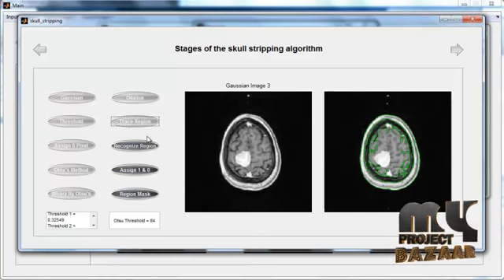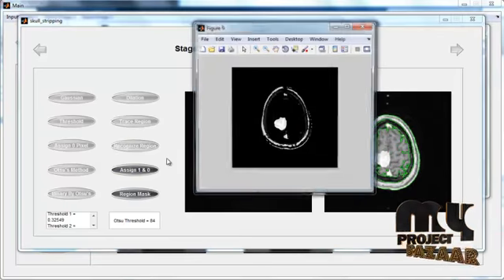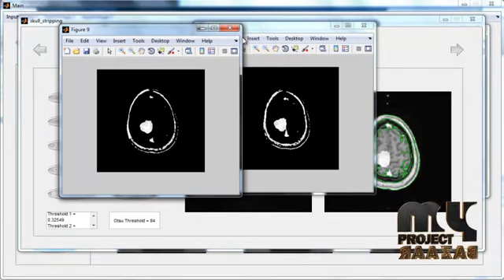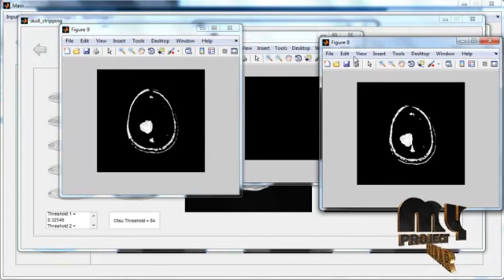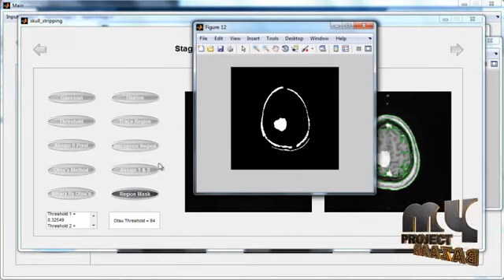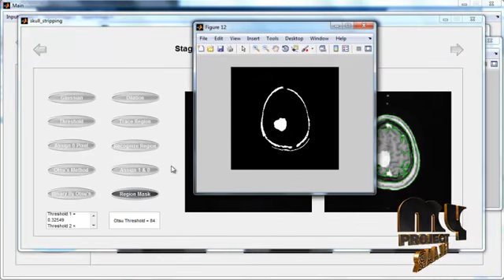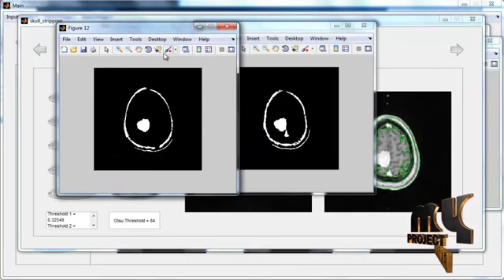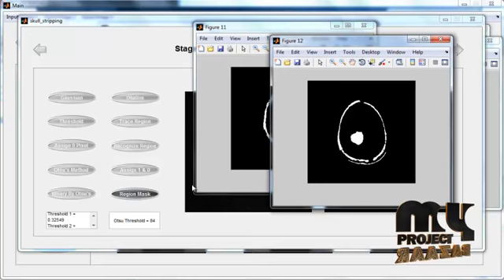Then trace the region. Now the region is traced, then recognize the region. Now the recognized region for images 1, 2 and 3 is shown. Now assign the pixel values as zeros and ones. Now the white area represents the ones and the black area represents the zeros.